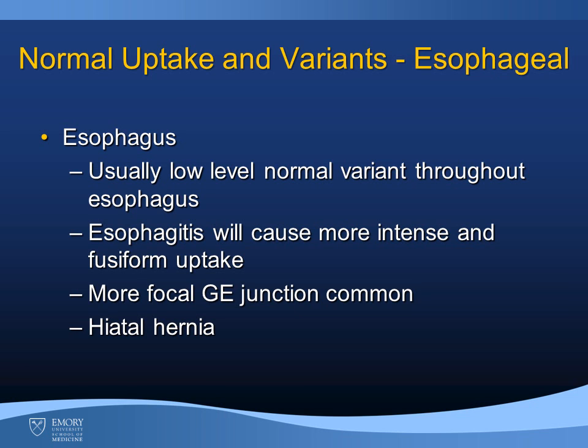Esophageal activity can typically be seen as low level throughout the esophagus. Now, esophagitis will cause more intense and fusiform uptake, and more focal uptake at the GE junction is common, as is uptake in a hiatal hernia.